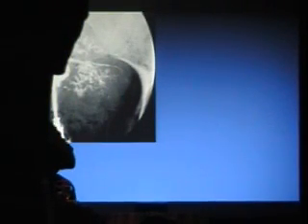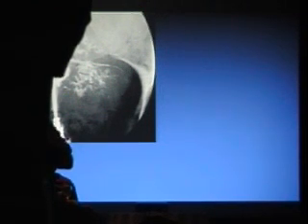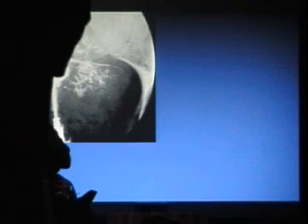The other differential diagnosis, of course, with fibroids is this, which on hysterosalpingography shows evidence of the cavity being filled, one tube just about opacified here, and multiple branch-like structures filled with contrast. Anybody? You're all asleep. Adenomyosis, great. Somebody said it.